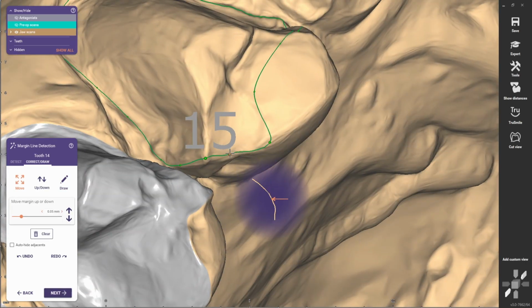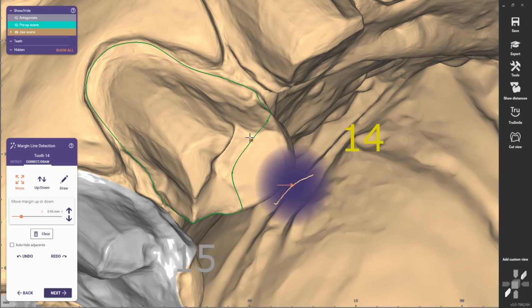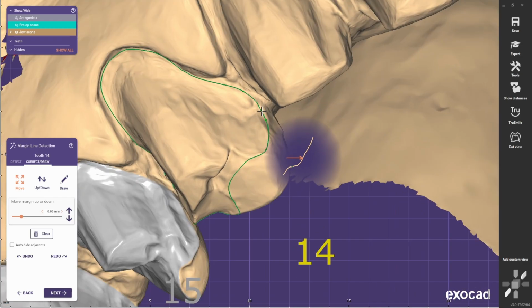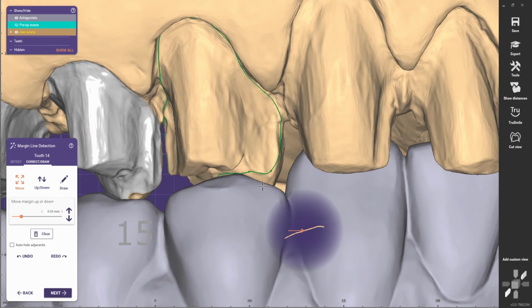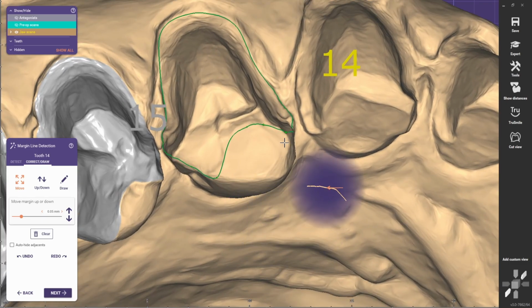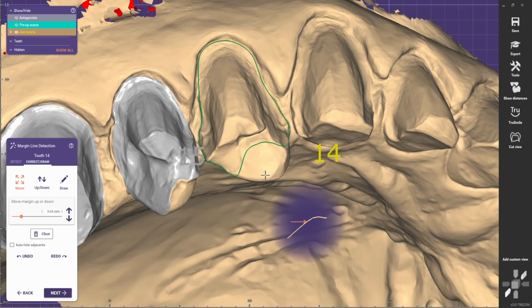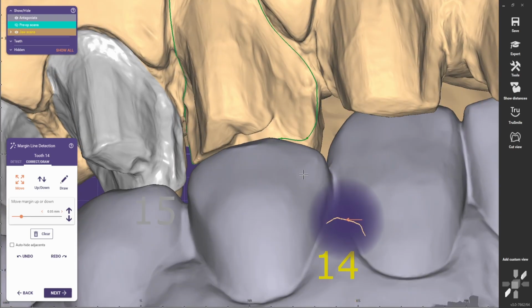When setting up the margins for premolar, sometimes they are prepped a bit towards the occlusal, so always check where is the contact and place the margin all around. Definitely we cannot get this part to be part of the veneer. We need to mark it around the contact.